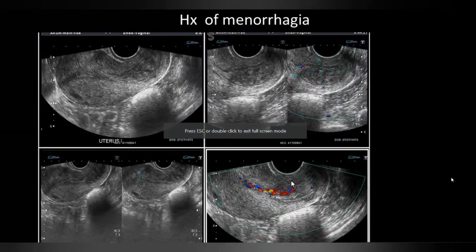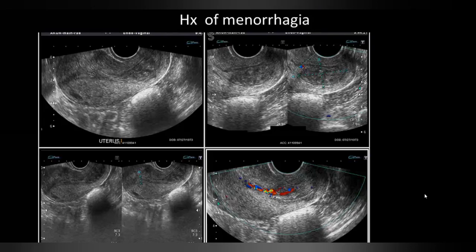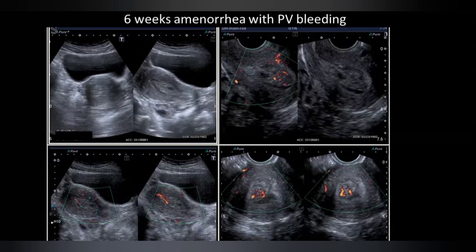This is an endometrial polyp which has prolapsed into the cervical cavity. Sometimes the clinicians say that there is a cervical polyp, but when we push hard on the vagina, we reach up to the exocervix, and then we tend to obscure it. So whenever there is a high clinical suspicion for a prolapsed cervical polyp, just pull out the probe a little, and then you would be able to see these lesions. Images taken from per-abdominal examination as well as transvaginal examination.